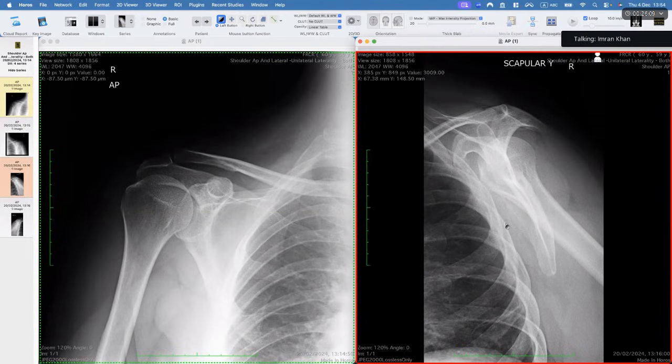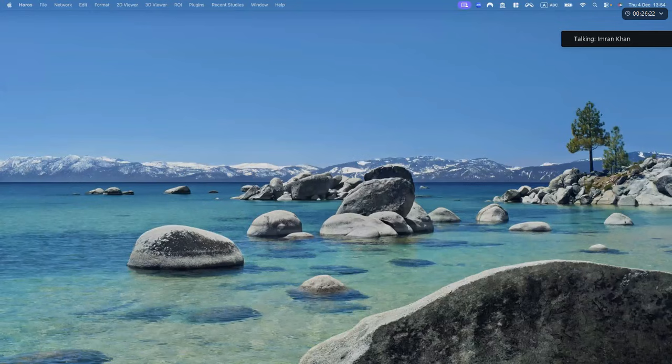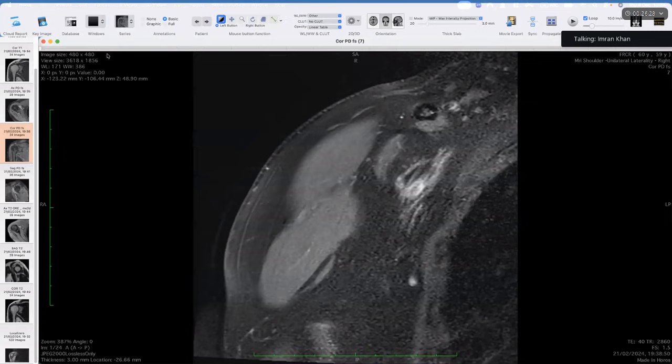The physician says, "What now?" Further evaluation with MR, in this case, the patient has pain. All right, so we decided that we were going to do an MR. Okay, so I'm going to bring up this MR.